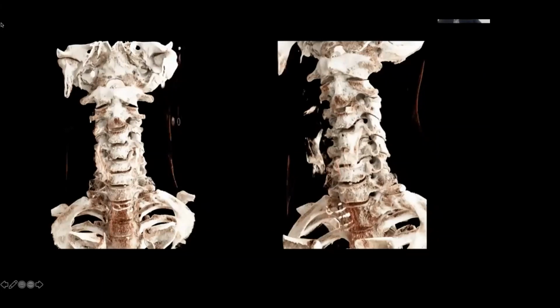If you look on traditional CT or MR, you often hear people talking about, oh, the neural foramen is narrowed because of facet arthropathy or facet hypertrophy or uncovertebral hypertrophy. And I never really quite got it, the uncovertebral joints were always this sort of imaginary, magical place that I only heard about when discussing nerve roots on cross-sectional imaging.